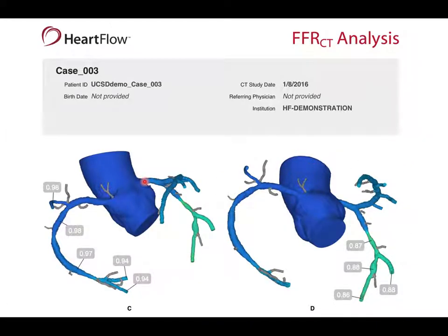So we now have this available at UCSD, and so here's that stenosis we were looking at in the CT. This is the left main here. The LAD is coming down here. There's the stenosis, and the drop in pressure shows that it would only be a 13% drop across that stenosis, and therefore you should leave that thing alone, right?